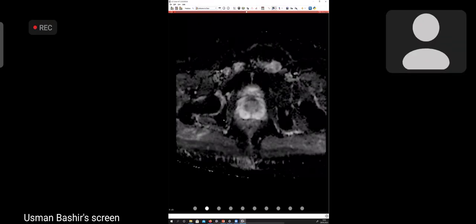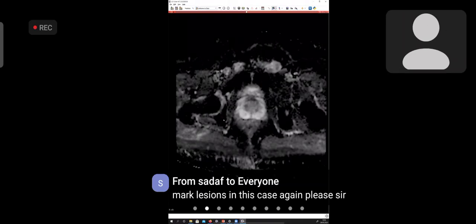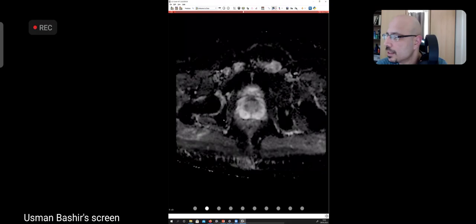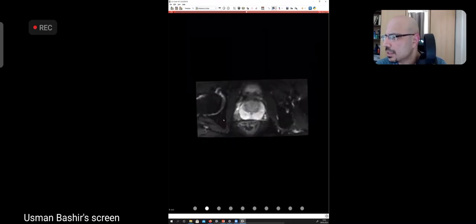But it's a great example for, pardon? So there's a question. Sir, when you showed the multiple images of this examination, somebody is asking which sequence was the 4th one on the column? Fourth sequence on that big template? Yes. I'll have to go back to it, but don't worry about it. I'll show it again. And this is post contrast. Let's go back to it, because I think I had to explain. Hang on. Let me just finish what I'm saying.